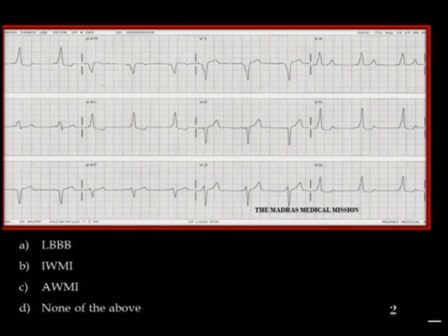For some chest discomfort, if the history of palpitation is not there, and if this ECG is looked at casually, you may think this is a patient with coronary artery disease. Several instances of these patients coming for an angiogram to the institute are known.